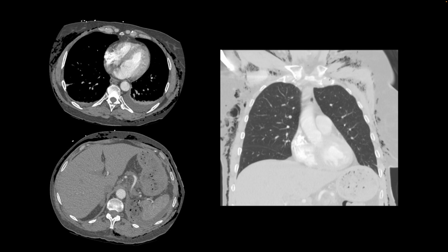This is our next patient. They underwent a left-sided nephrectomy. That was a laparoscopic procedure, and we see the signs of it right here with absent kidney on the left side, and they presented with severe abdominal pain 1 or 2 days after their surgery. And so on their CT scan, we find that they have small pleural effusions, left worse than right. They have extensive chest wall emphysematous change, also seen right here.